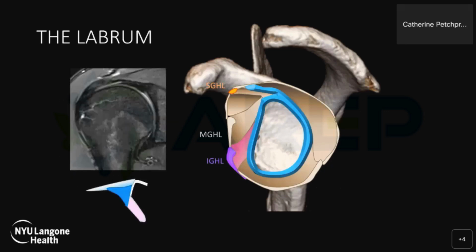The superior labrum and biceps tendon arise together and are firmly attached at the supraglenoid tubercle. The biceps tendon and labrum are low signal on proton density weighted sequences, and the superior labrum is normally triangular shaped. There is normally no or very small smooth fluid-filled cleft between the base of the superior labrum and subjacent cartilage.